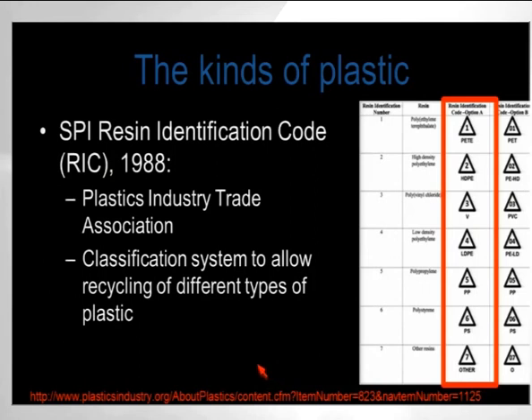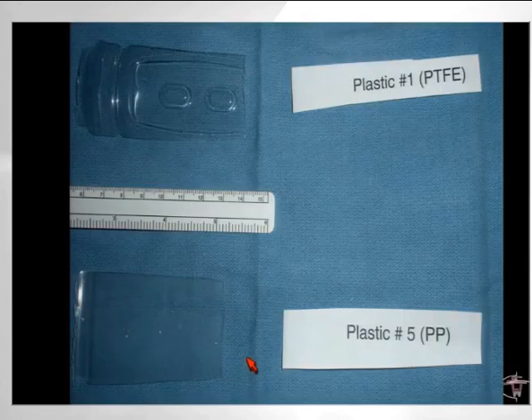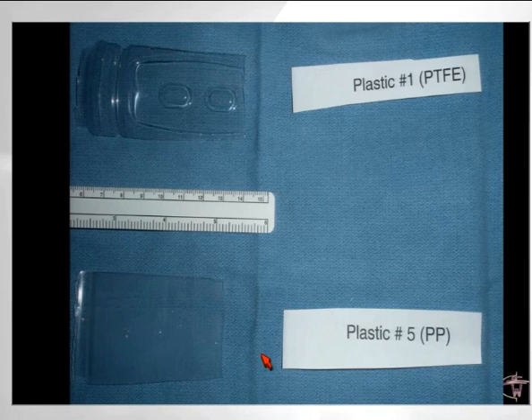They're pretty much on every plastic thing that we use in our daily lives. There's a little triangle in the bottom that tells you what kind of resin or plastic is used. This is what the samples used looked like for our little experiment. And fortunately, plastic foreign bodies are very uncommon in the clinical setting. However, many things that we use as healthcare providers that we insert into patients are made out of plastic. And I think that's why it is useful to be familiar with the radiographic appearance of plastic foreign bodies.